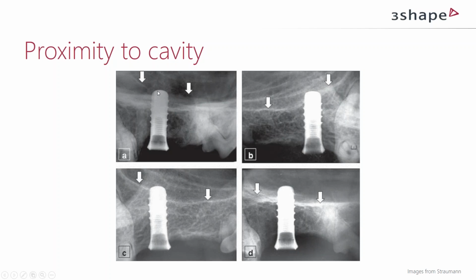If we have an implant that is rounded and nice like this, we can expect that the sinus tissue inside actually will be lifted up like a tent with a pole. But we never know, because before placing the implant we actually used a very sharp burr, so we don't know what happened. So we could punch that.